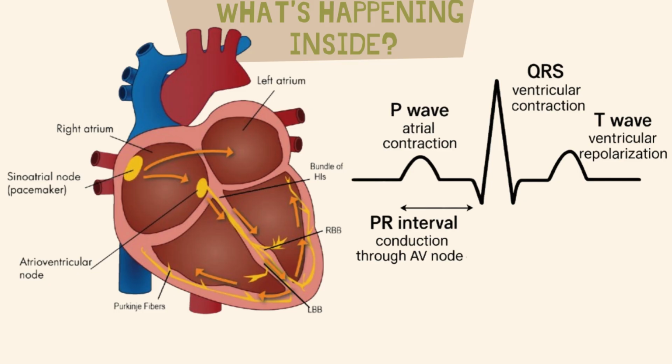From there, the signal spreads into the Purkinje fibers, which fan out across the ventricular walls, and they deliver the impulse to the ventricular muscle cells to contract. This rapid depolarization and contraction of the ventricles produces our beautiful, perfect QRS complex. In between there, we have our isoelectric ST segment, where there's no electrical conductivity, and this is kind of the pause of ventricular relaxation right before the T wave, before we have ventricular repolarization again.